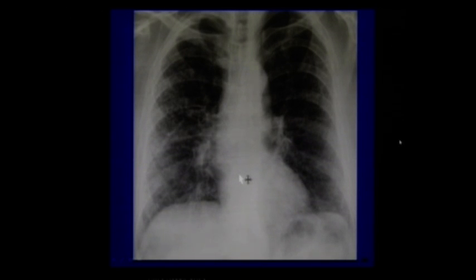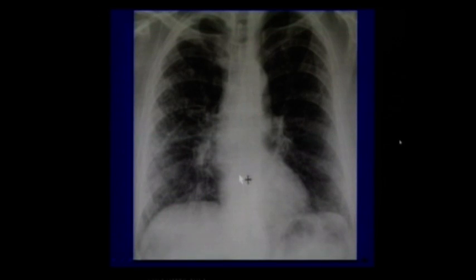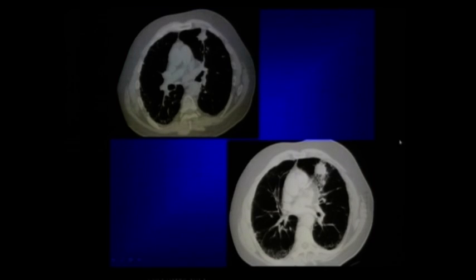See, for example, even during a comprehensive checkup, if you find a small lesion in the chest X-ray, it needs further evaluation. But here, you are not suspecting anything. But it is a known case of idiopathic pulmonary fibrosis. See what happened between 3 months of waiting for a lesion. In the same chest X-ray, that lesion is not even discernible, but it was quite small. So, you should have picked up that it is quite an irregular lesion, a mass lesion probably, and it proved to be one.